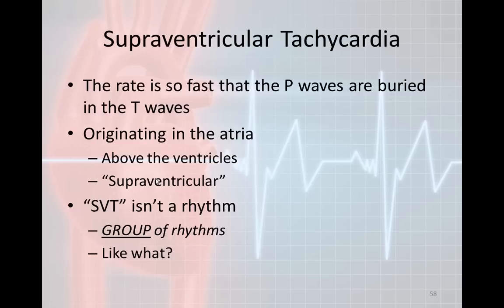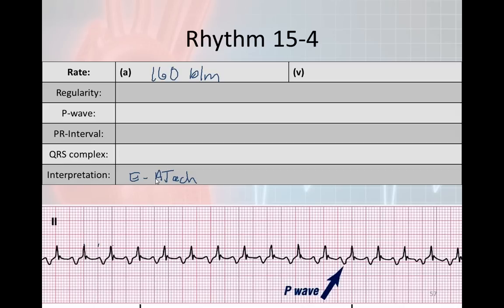There are a lot of people out there, especially a lot of old-timers, that you'll hear this term a lot. Oh, well, it's SVT. It's SVT. I'm going to back up one slide right quick. A lot of people would look at this and automatically classify this as SVT. Why? Because it looks narrow. We'll pretend that it's narrow and it's fast, therefore it's SVT.